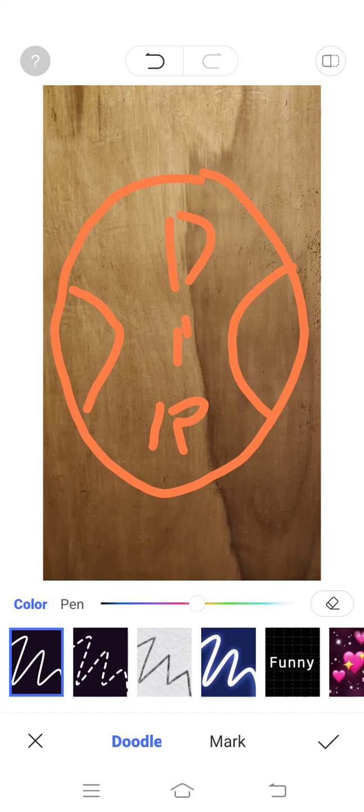This is the part of the lens wherein you're going to use while you are viewing intermediate distance. Let's say, for example, distance from 20, 22 inches away. We're at arm's length away. Okay, so that's the area here that you will be using. The one for reading, the one with an R, okay, the down side of the lens. This is the one that you use for reading at near, let's say about 16 inches away from your eye.